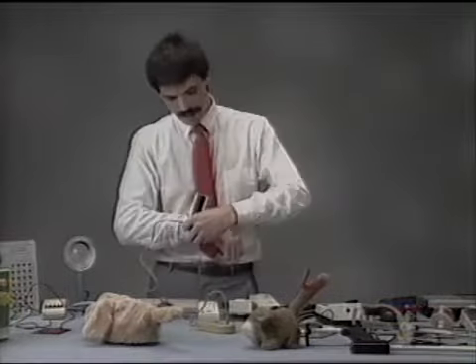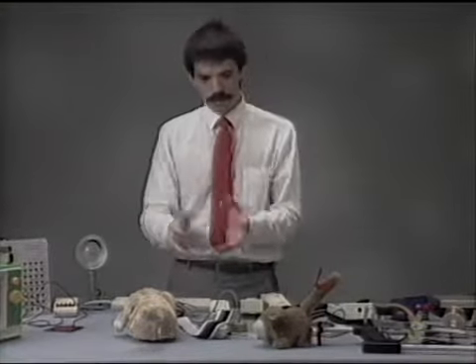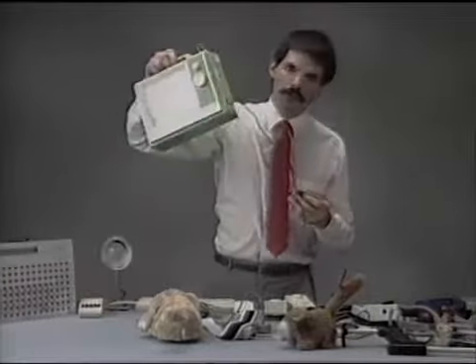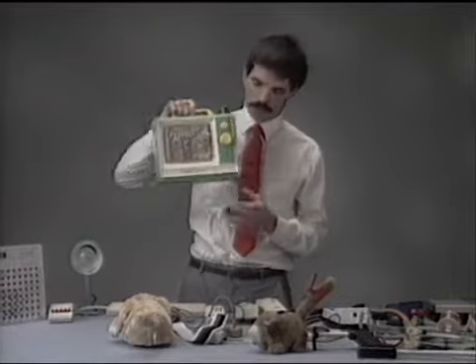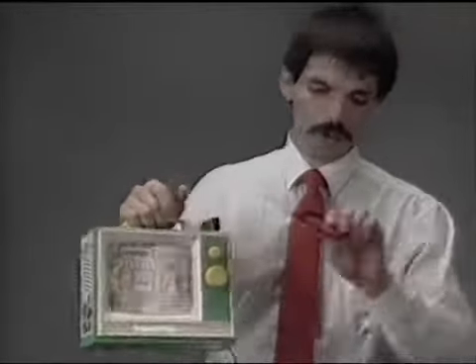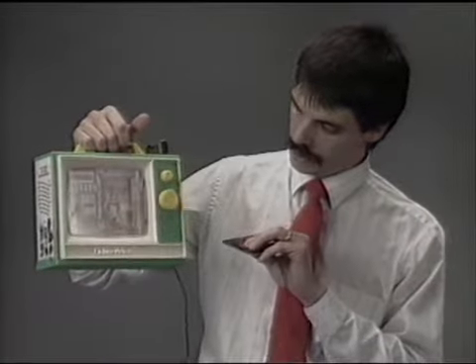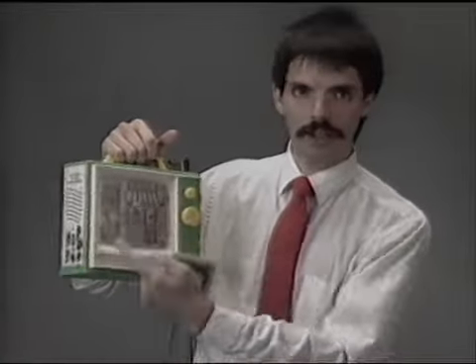That's kind of nice. As we move on in sophistication from toys that just do one particular thing, here's a toy, and you've probably all seen regular music boxes. This particular one is designed so when you wind it up, it starts to play and you see Sesame Street characters go back and forth. By adding this switch, and this is called a wafer switch, very flat, when I hit the switch, the toy begins to operate. And what happens here is that we have a linear scan.